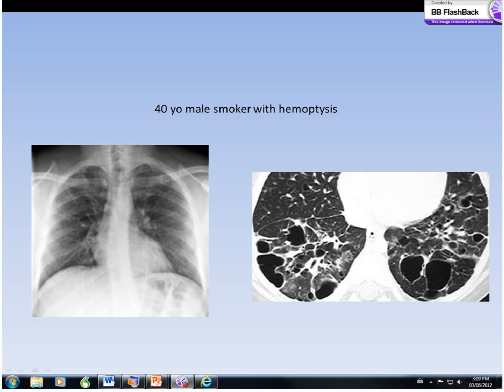Not the best example, and may not show well on the projector screen, but there are some areas of lucencies on both sides of the lungs. This is a 40-year-old gentleman with hemoptysis, and it wouldn't surprise anyone, I would presume, that this patient has abnormal airway function, and microorganisms likely live in this area, and inflammation and disruption of vessels would lend itself to increased risk of hemoptysis.